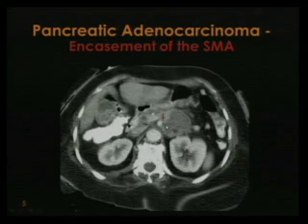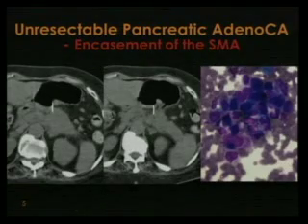That's why, you know, sometimes it's difficult and there is inter-observer variability. Probably if I have to say, I would say that it's more concave than convex, but, you know, it depends on the radiologist. Also, this tumor was confirmed and was adeno.